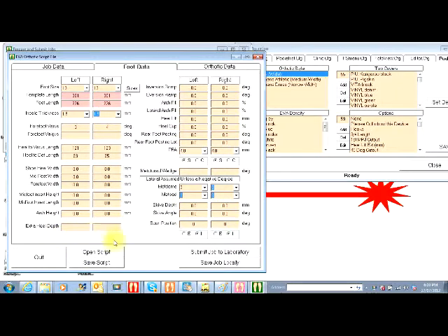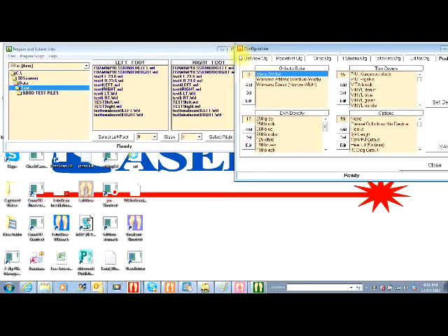Once we've got all the information we want, we can submit the job to the laboratory and then save it locally, which I will then do in another video and explain that, because it'll be a little bit hard doing it from here.